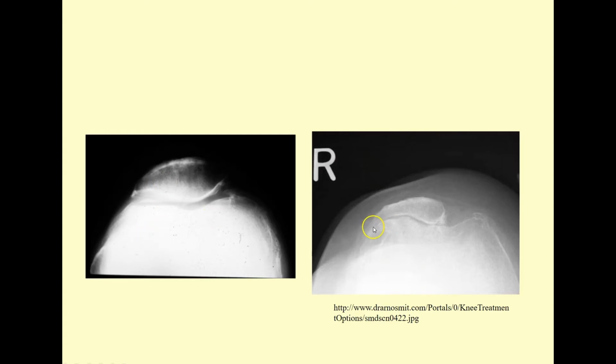Now, what we're seeing here on this lateral cell, let me finish it. So here we got, again, your typical subchondral sclerosis. The joint spacing is a little difficult to evaluate and judge, but if you have subchondral sclerosis, like we do here, you can bet the farm that we've got loss of cartilage thickness and integrity. And if you didn't appreciate the subchondral sclerosis, you have to deal with the osteophytes. And you should easily see these if you're doing your big white line assessment. How could you miss it? We also have this big osteophyte on the femoral side. So you see osteophytes, continuous cortex, bone growth at the joint margin. It's an osteophyte. And that tells you that the third stage of DJD, decreased joint space, subchondral sclerosis, marginal osteophytes.